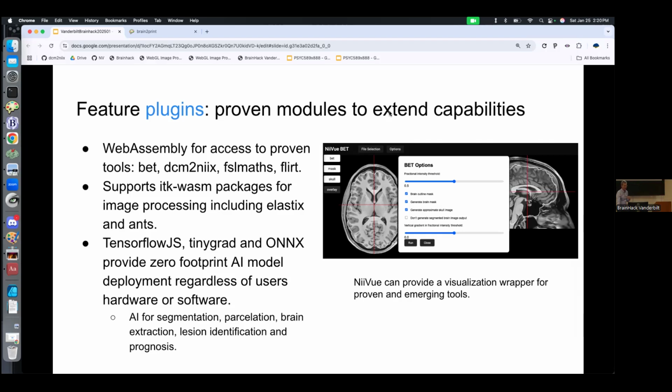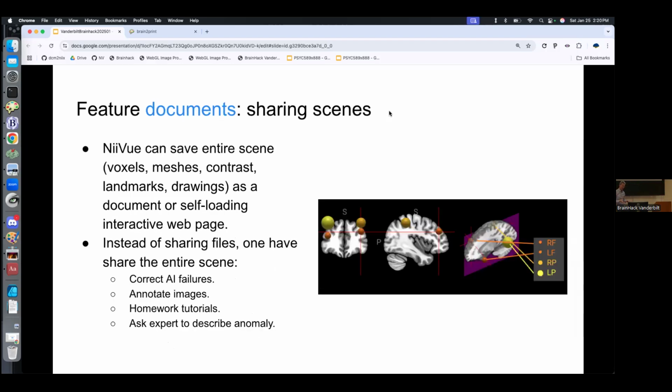So that's one of the nice aspects of creating this nice wrapper. There's some other things we can do that I think are really important with web pages that are kind of surprising. And it's something that you could say our first aim was, let's try to replicate what AFNI and FSL and FreeSurfer, the three teams we're actively working with. We wanted to make sure we could check the boxes of everything they wanted to do.